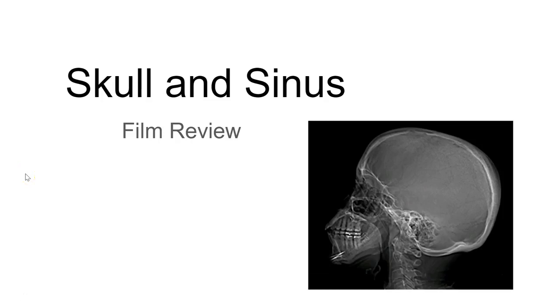Hello and welcome to a film review of the skull and sinus projections. I'm going to divide this presentation into two parts. We'll talk about the skull positioning first, and then in part two we'll discuss sinus positioning.